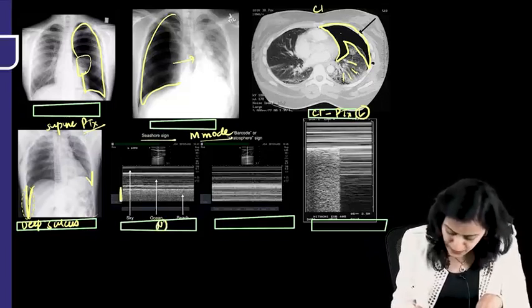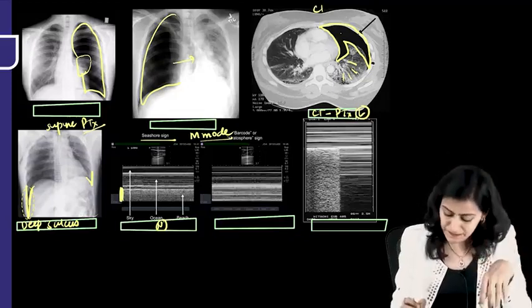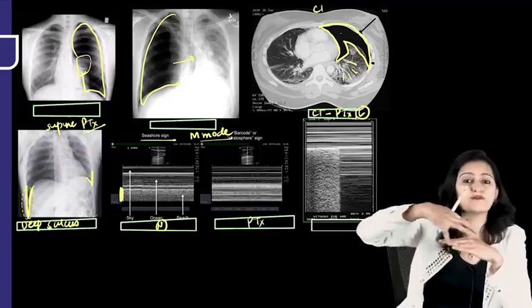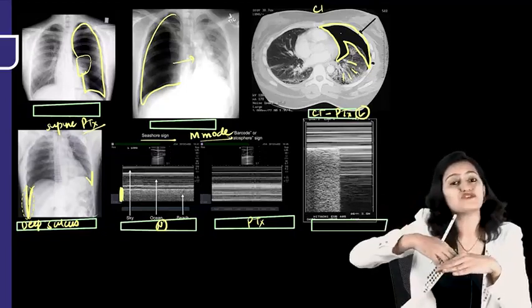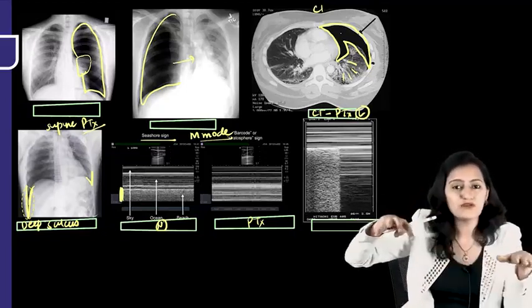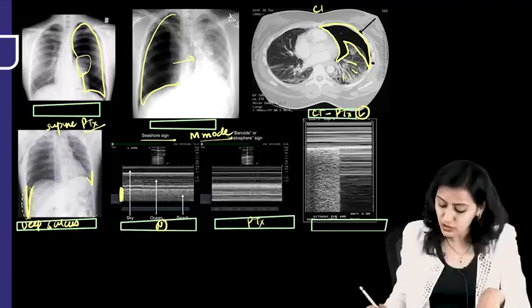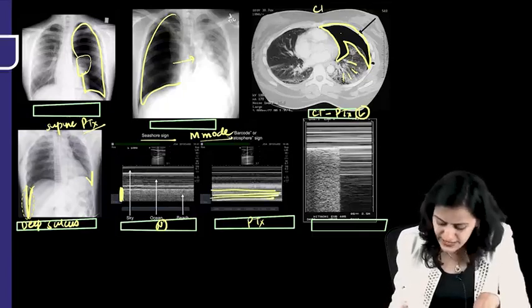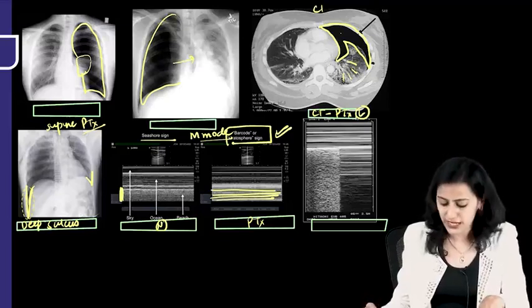In the lower part, which shows the lung movement, you would see the granular appearance, right? If it is pneumothorax, the pneumothorax overlying the lung does not allow the sound to penetrate and visualize the lung movement. So in the lower part, you would not see the lung movement. There would be flat lines like the barcode or the stratosphere. So look at the lower part. You will see the flat lines. So the barcode or the stratosphere sign is what we see in pneumothorax.